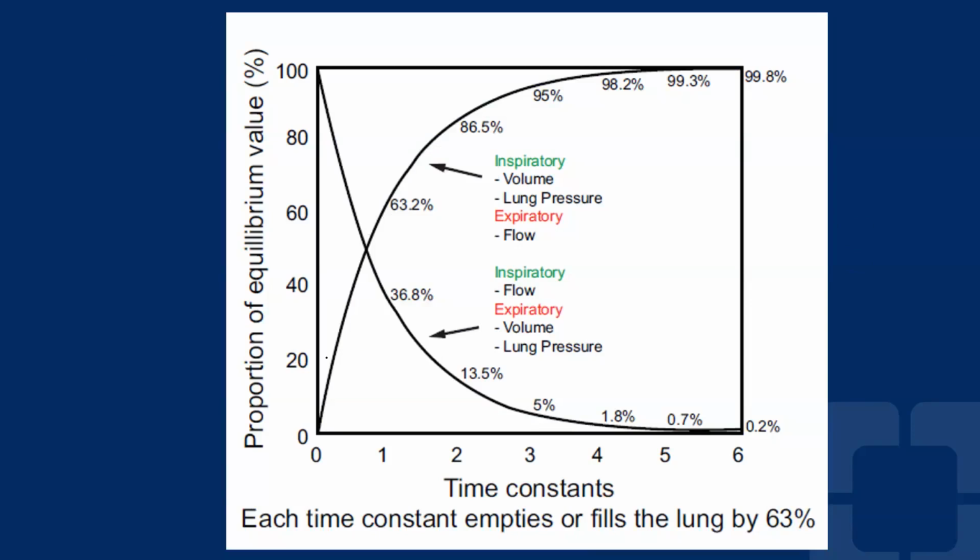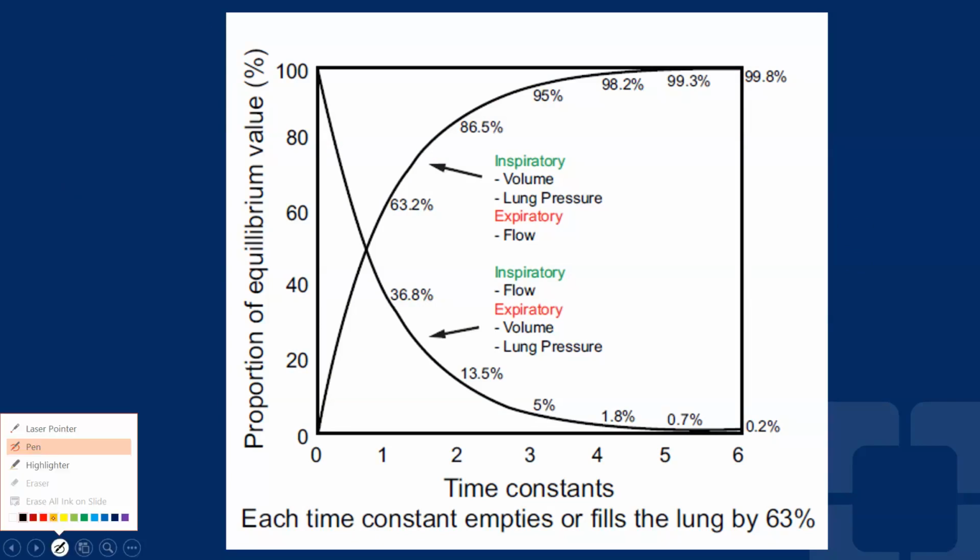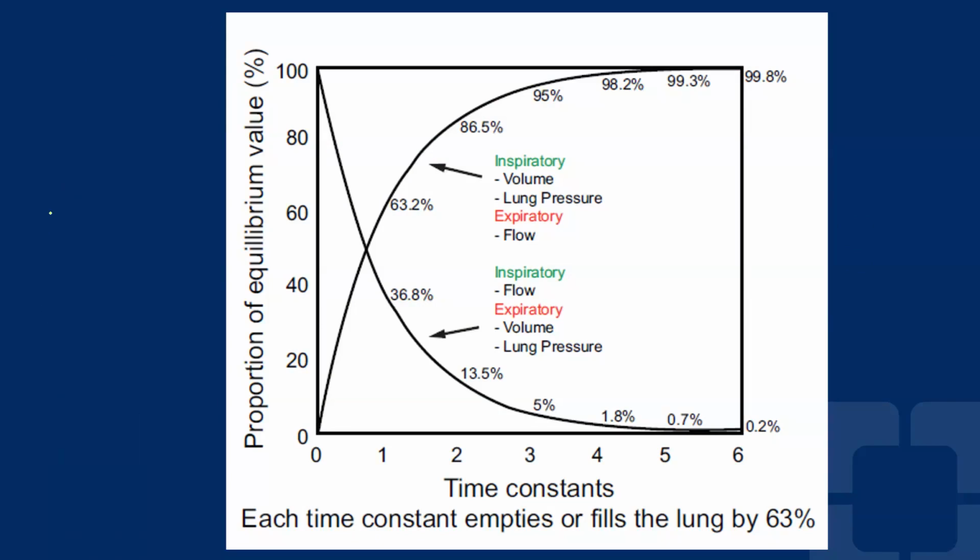All right. The second one is, again, the same waveform with airway pressure on the top, flow, and volume. And in this mode, based on what we're seeing, what we're controlling seems to be the flow. And we know that because it has a geometric shape, so it looks like a square.